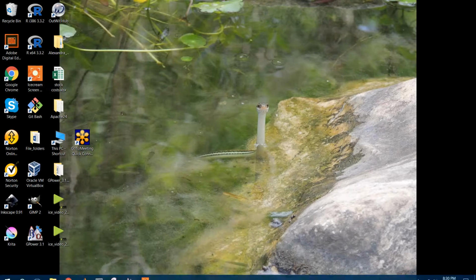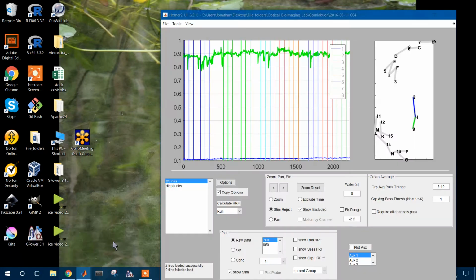I just got a question on how to manually prune stimuli on your data. So this is some data of my head, and you notice all these vertical lines here of different colors. These are all my stimuli. The color coding just denotes that each one designated with the same color is of the same stimuli. Say if I had some cognitive tests, they would all be these blue ones, and I did them 3 different trials. That's just for averaging purposes.